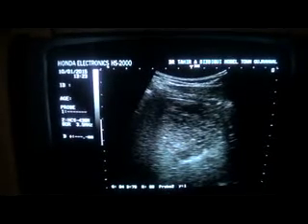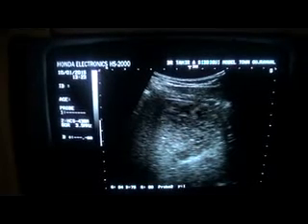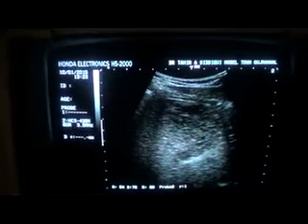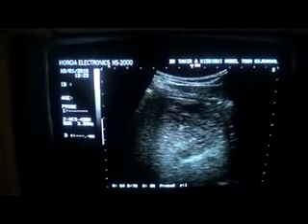Another thing can be that this is a thin walled cystic area filled with echoes, different strength internal echoes can be another explanation for this. And if someone wants to aspirate, we'll have to use a thick needle to get it out.